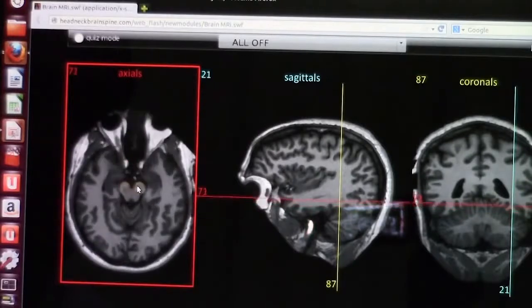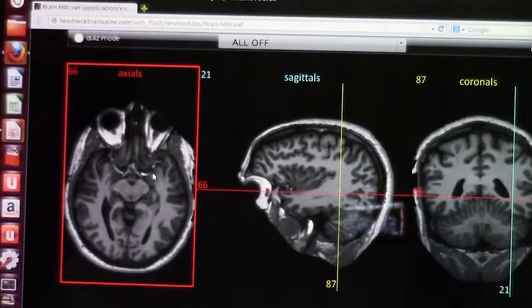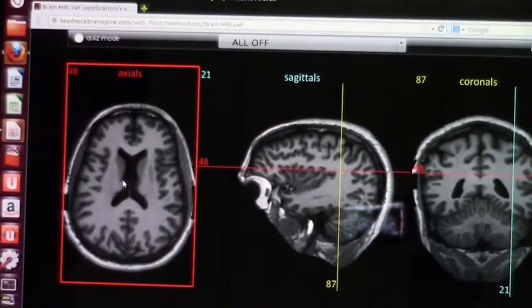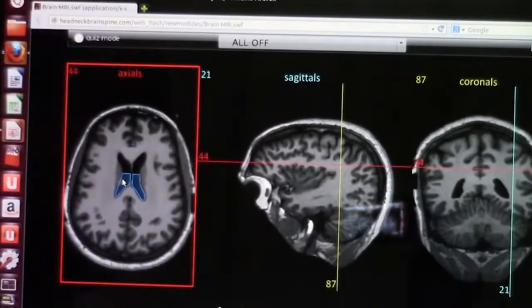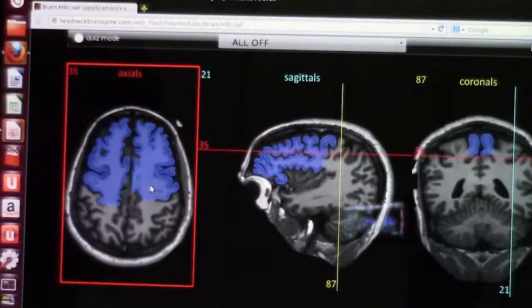And as you go up, you come to the supraclinoid segment, and then you go to the middle cerebral artery. And here you see the optic chiasm nicely, and here you see the mammillary body nicely. As we said, T1 is extremely important for anatomy in pediatric neuroradiology, so you can see clearly if there is any evidence of migrational abnormality.